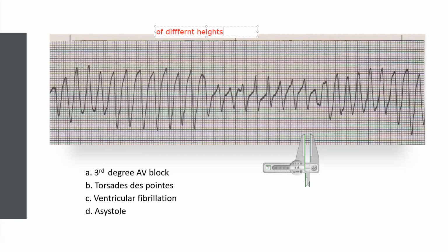So as you could see in this particular example, you notice that there is, in fact, a tachycardia, a fast rhythm. And if you look at the points right over here, you're going to see once again that there is variability of the points that are going to be seen right here.